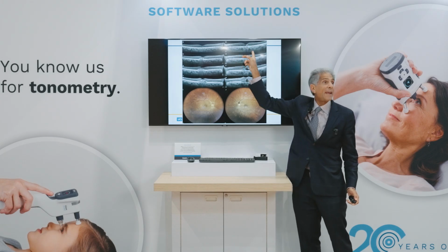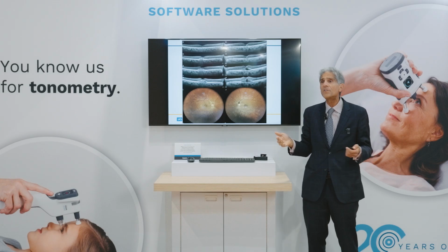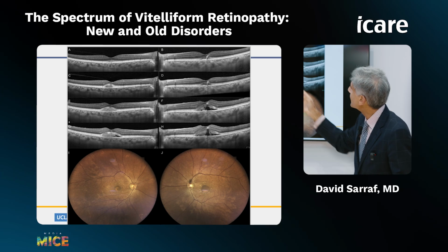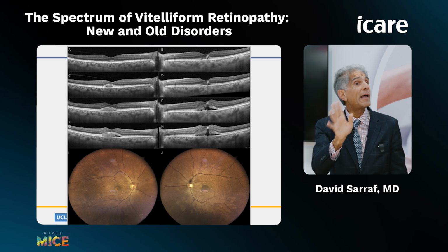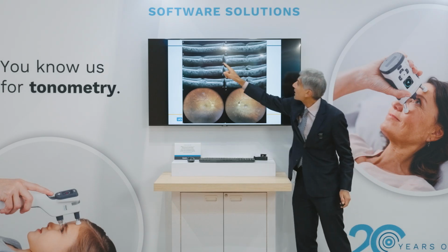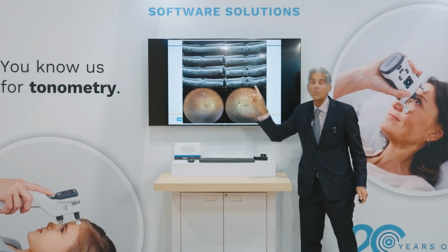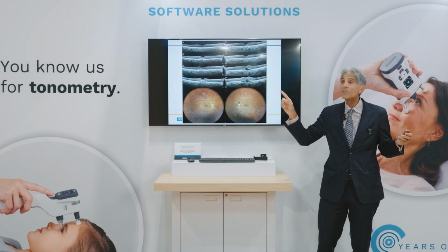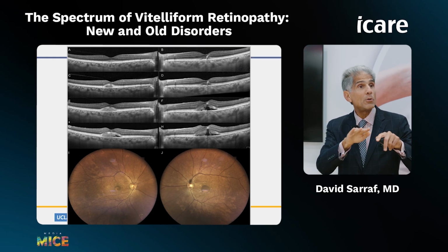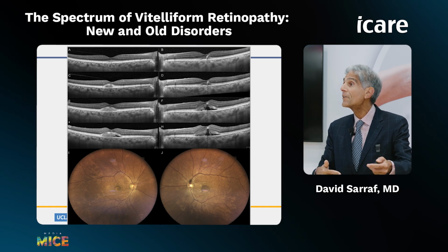Keep in mind, this is an 80-year-old, and his choroid is over 300. Typically, 80-year-old patients have choroids of 150, not 300. And so we said, okay, this must be pachyvitelliform maculopathy. We'll just monitor him. But as he came in, look what happens. The lesion gets bigger and bigger and bigger, in both eyes, which is kind of unusual for pachyvitelliform maculopathy. Usually the lesions will stabilize or they'll resorb and progress to atrophy.